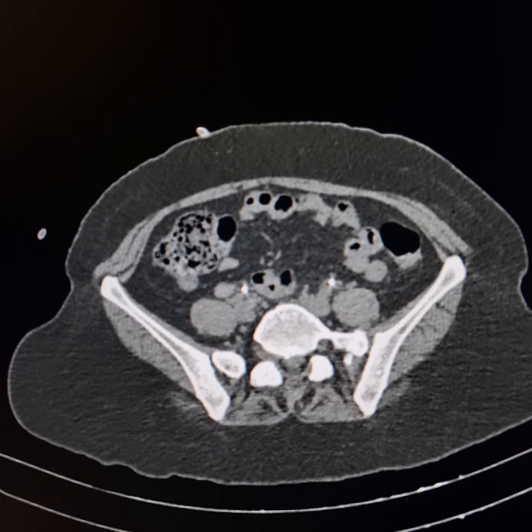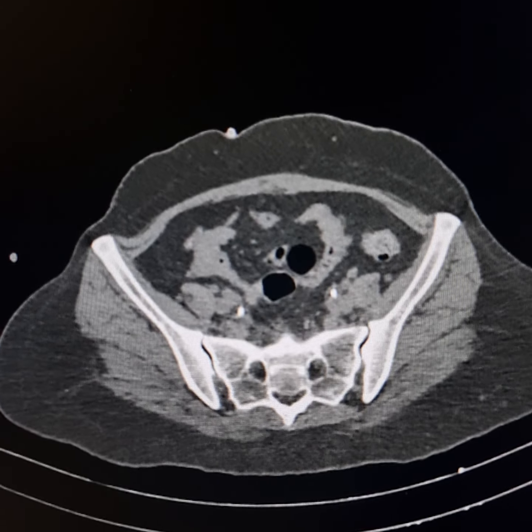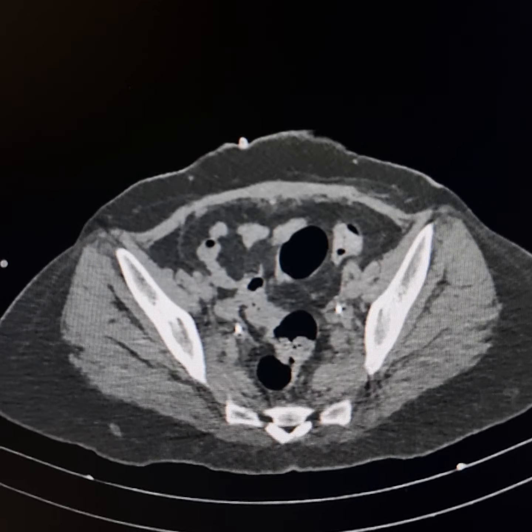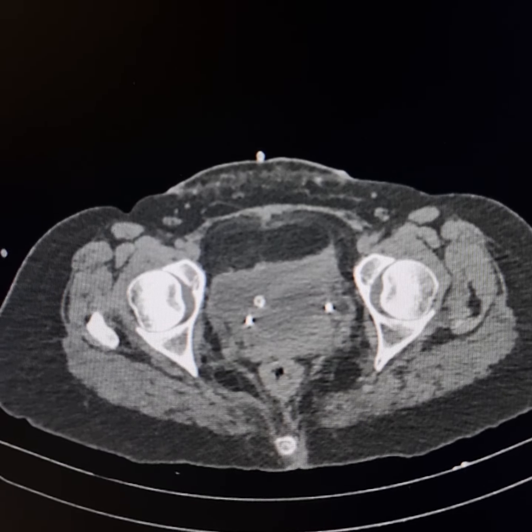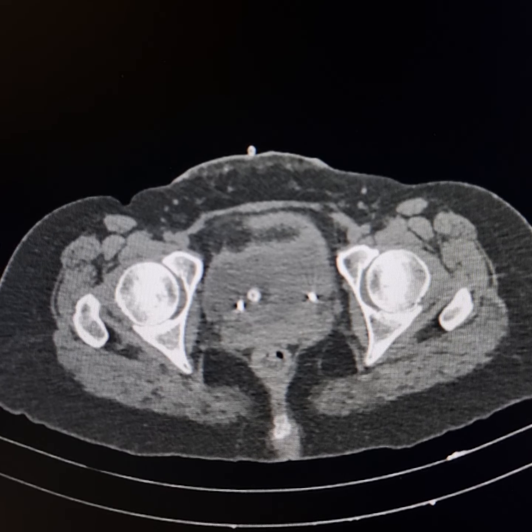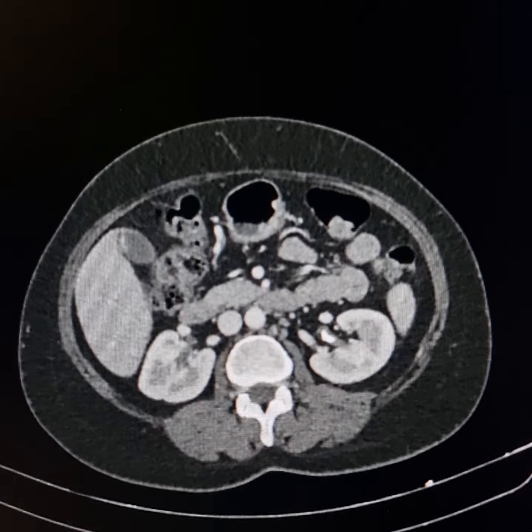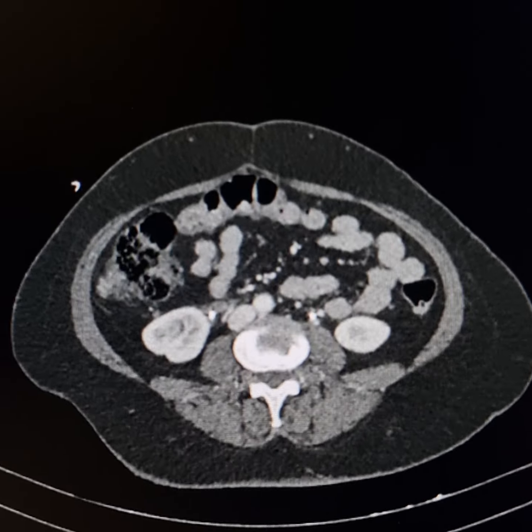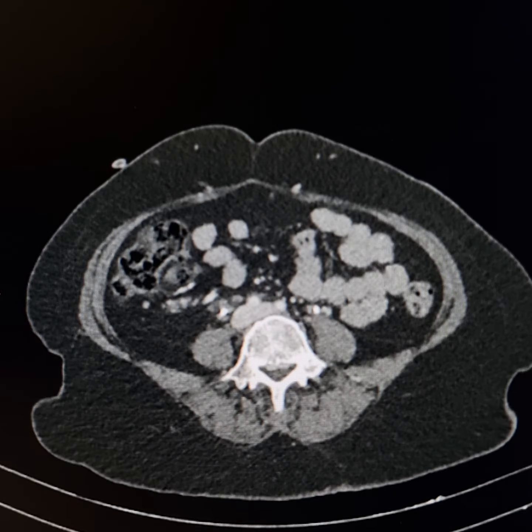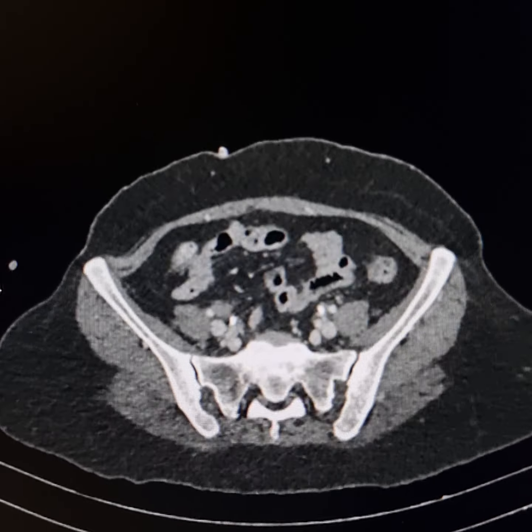Ureteral injury was suspected, so DJ stents were placed on both sides and the patient was catheterized. A few days later, the patient started passing urine through the vagina. This CT scan was done to localize the site and side of the ureteral injury. This is the immediate scan.